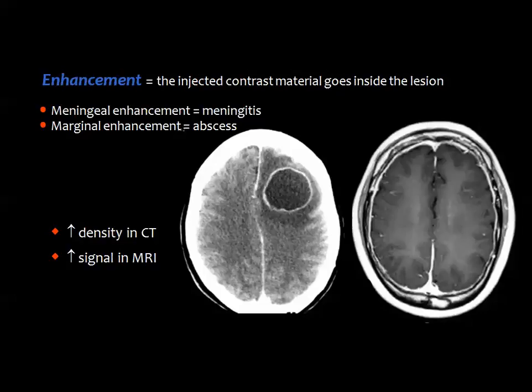informations about intracranial infection. And the first issue is we always need to inject contrast media intravenously whenever we are evaluating a case of suspected intracranial inflammation or infection. And this applies for the CT and also for MRI. Contrast injection is very important even if the lesion did not enhance after injection of contrast. This will help in the differential diagnosis.